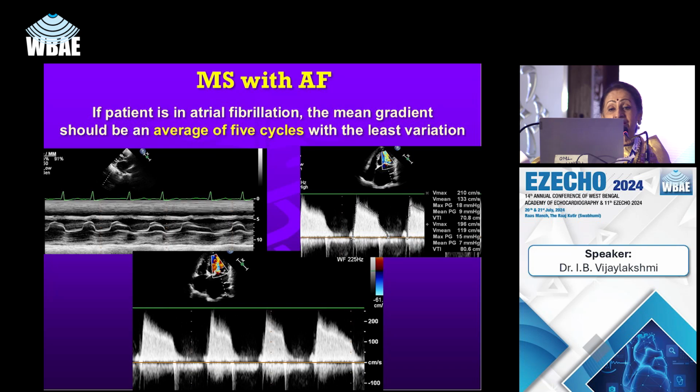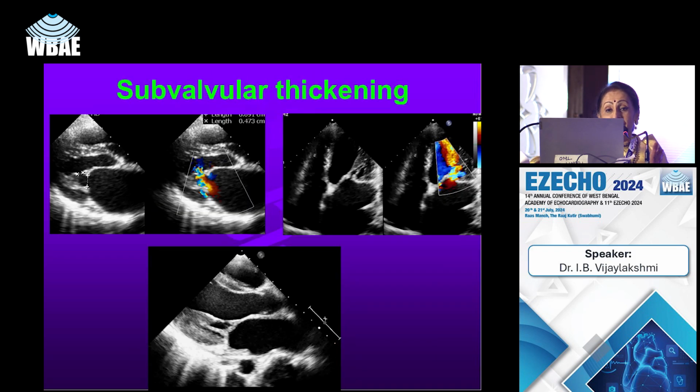An increase in cardiac output, or tachycardia coexisting with MR, can overestimate the mitral stenosis. Here they have said mitral stenosis with mild MR, so they have probably not overassessed, and the assessment is right. Then pressure half time is very important.